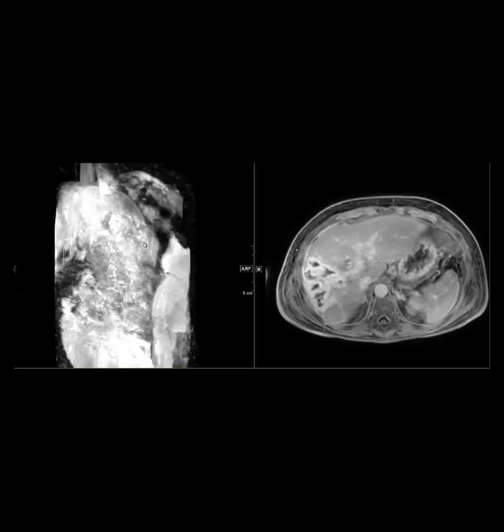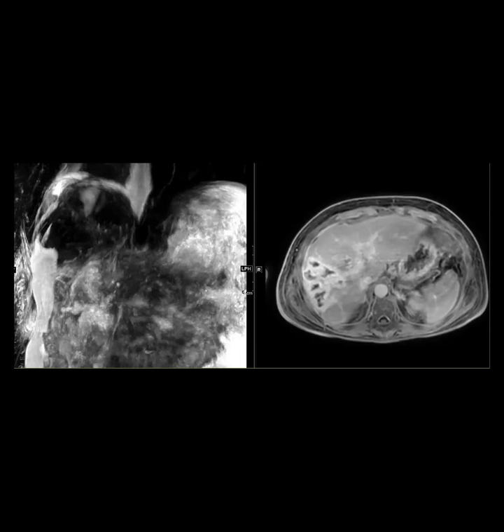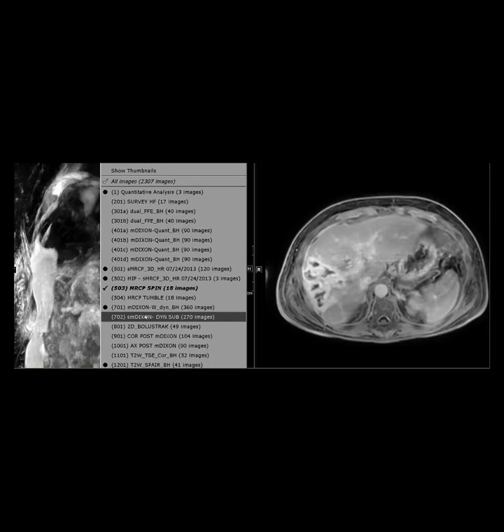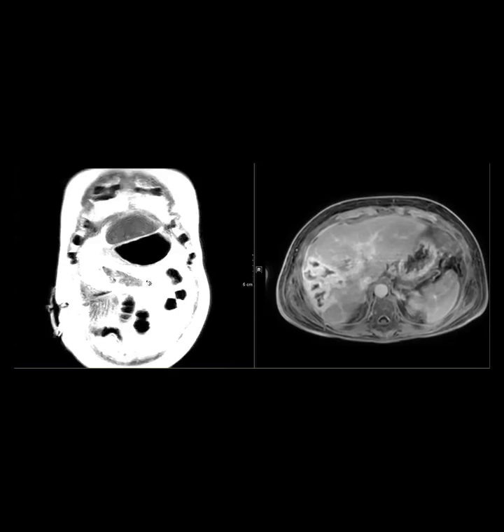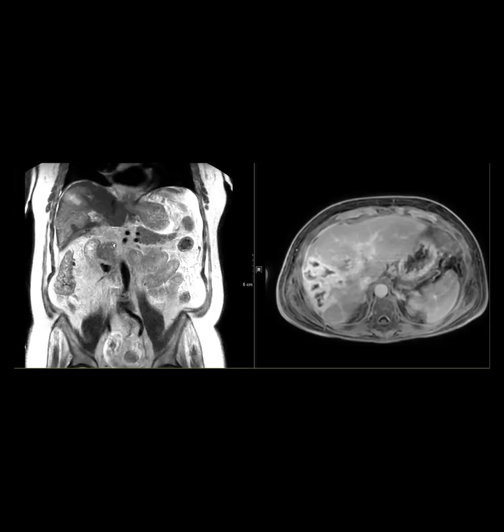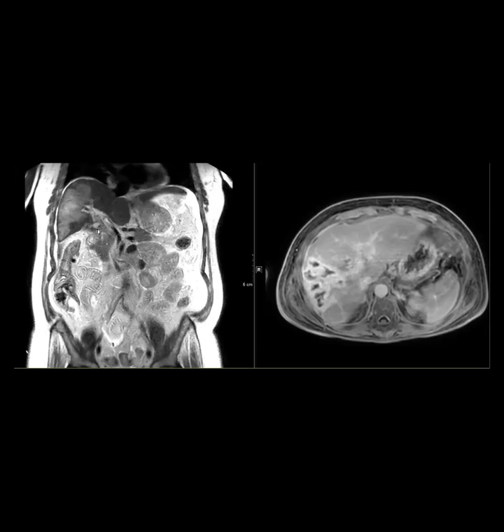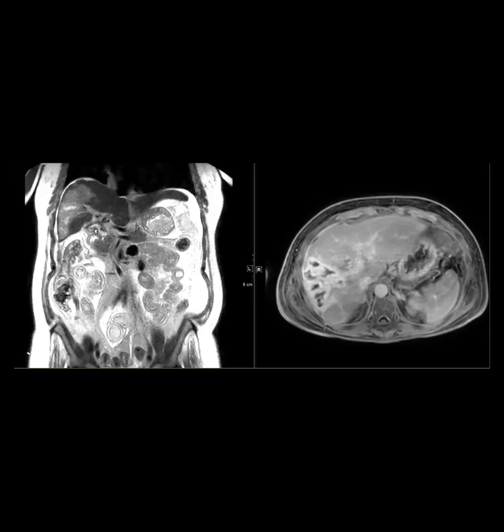I can't find the ERCP images that the surgeon shared with me for some reason, but basically the ERCP looked exactly the same. The common bile duct was transected. So the distal common bile duct, okay, and this is the biloma.